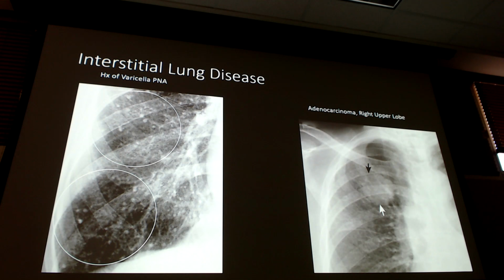Okay. So adenocarcinoma, did that big mass jump out at you guys? Right, as far as abnormal. By the end, you'll know what it is. If I suspected adenocarcinoma, this is just funsies, how would we confirm that? Anybody know? Yeah, we're going to send them for a biopsy. We're going to make sure.